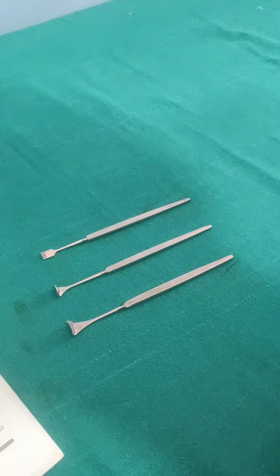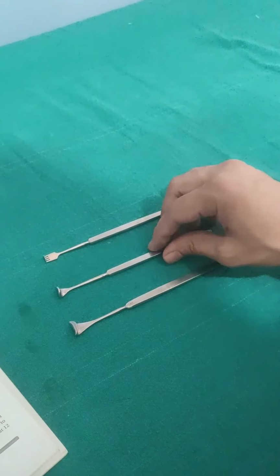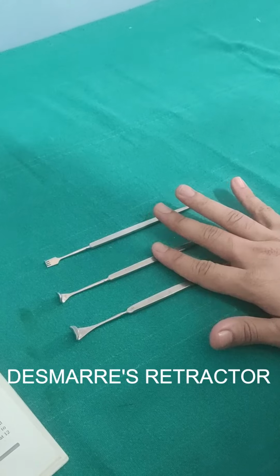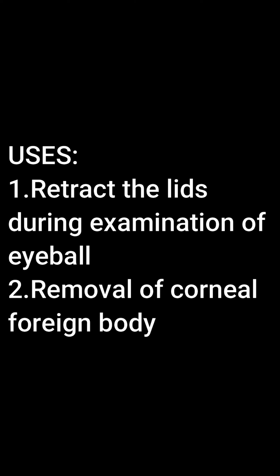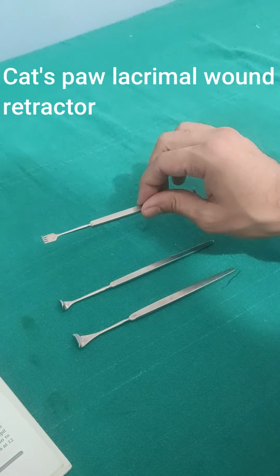These three equipments are the retractors. These two equipments are the Desmarres retractor, and this one is the cat's paw lacrimal wound retractor.